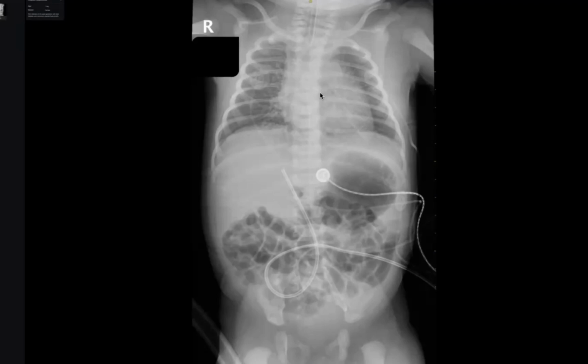And when you see the patient is intubated, this means that you need first to concentrate here. In my opinion, the baby abdomen is easier than the chest. Why? Because you either find necrotizing enterocolitis with its complication or any dilatation. But here, there are many pathologies, including even the heart.